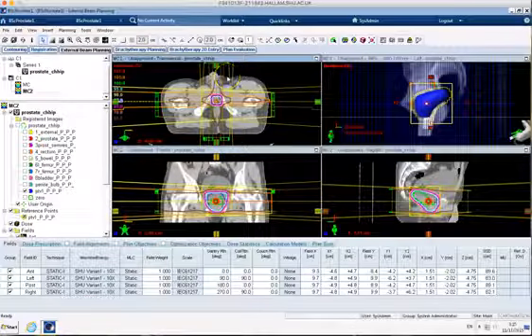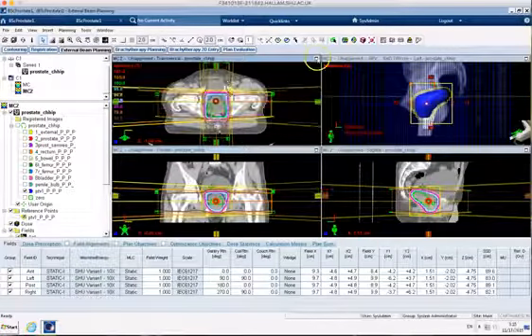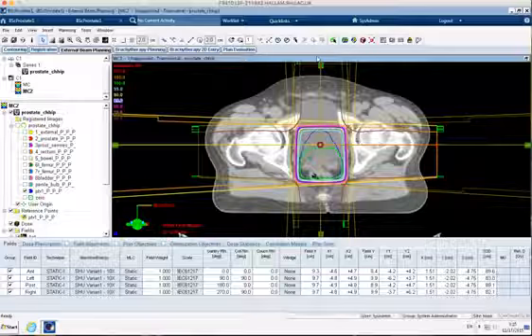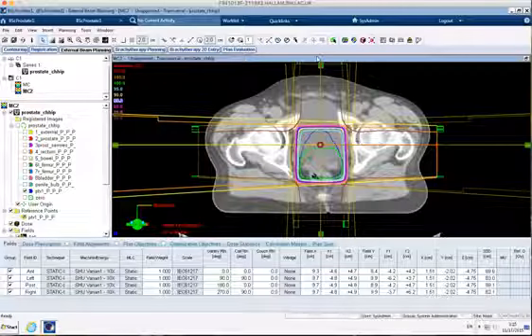So the first thing we're going to optimize, I think, is going to be our beam weighting. And now I'm going to do this in a set order just for the purposes of the video, but actually you could do these steps in any order that you want. So what I'm going to suggest is that I want to reduce the dose through one of my fields, and so just have a little bit of a think for a second what that field might be.